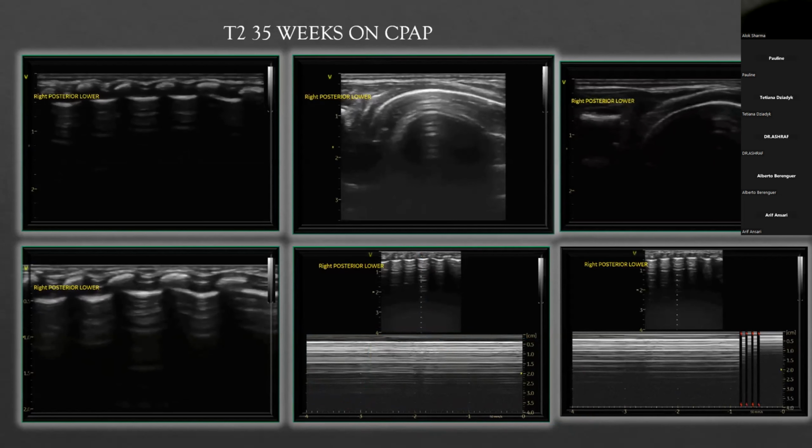For the GE machine, it's called speckle reduction imaging. It ranges from 0 to 5, and usually I will keep it at 0 or 1. On the GE, that's what it's called. I think that's also what it's called on the Sono side.